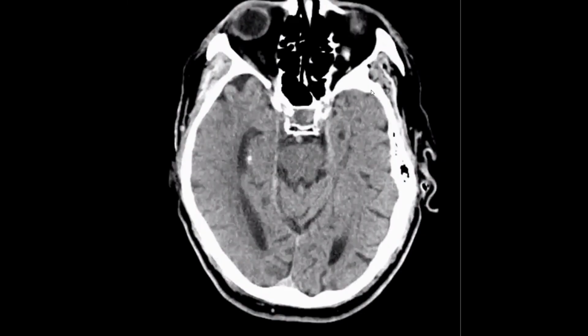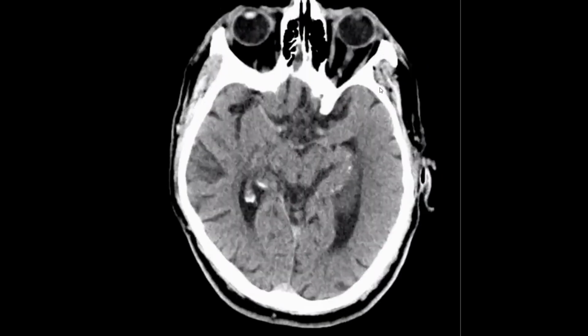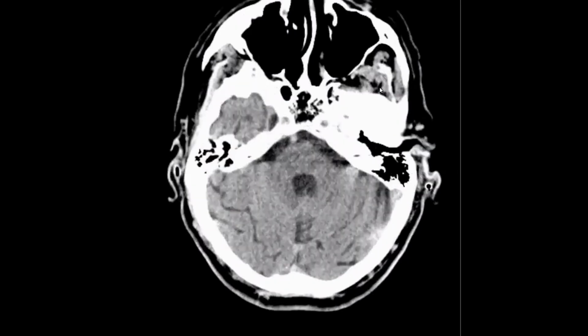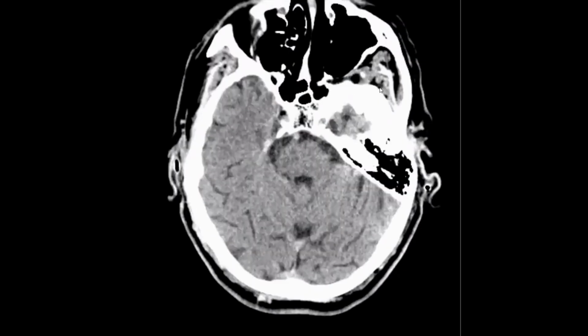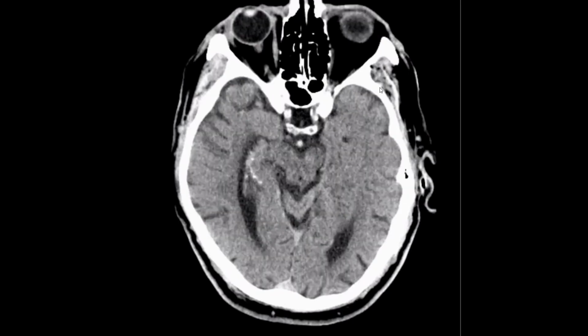You started to check the vessels and the middle cerebral artery. Which vessel do you want to check more? I want to check all the vessels, starting from the vertebral and going up to the basilar. I would also like to check the internal carotid in the lower cut. Checking the basilar artery, it appears fine.